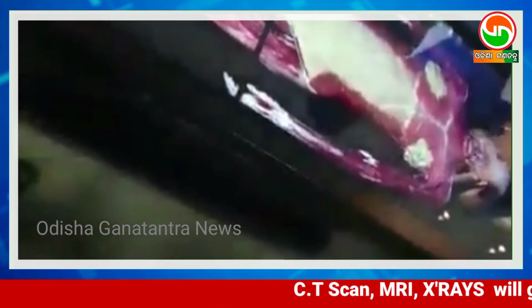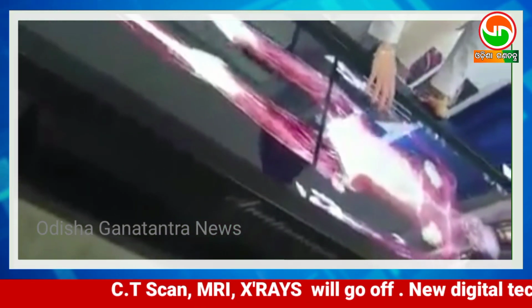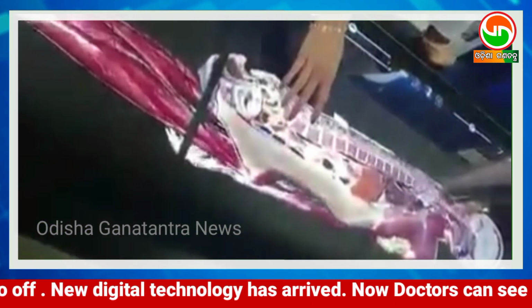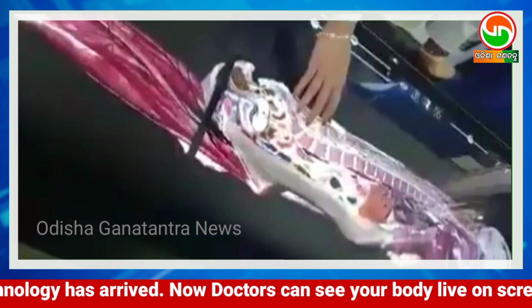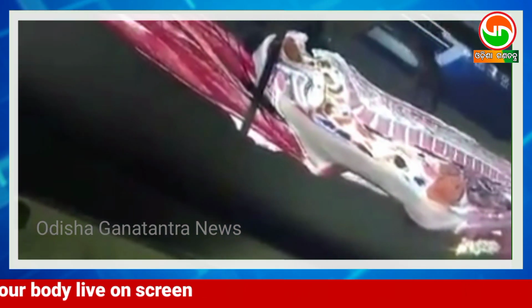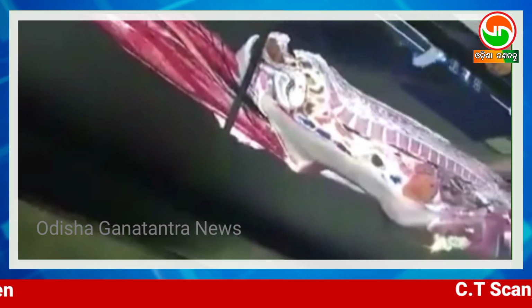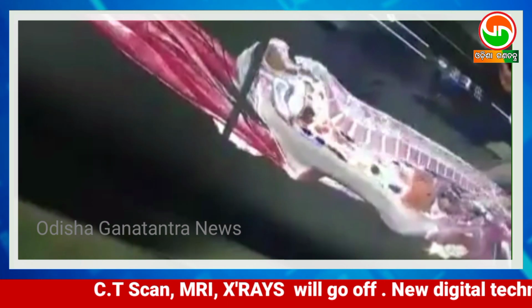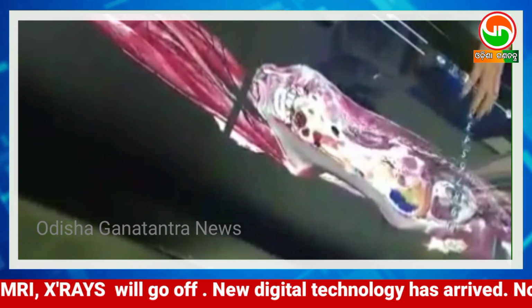So here I can start off with cutting down the middle. And then from here, I can show the anatomy as it was at the time of death. So everything is accurate, there's no rendering done. Since the cadaver was flash frozen, there were scans that were taken of the cadaver itself, and then from there you can see the anatomy as it was at the time of death. You can also isolate or annotate different parts of the system.